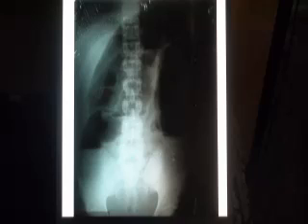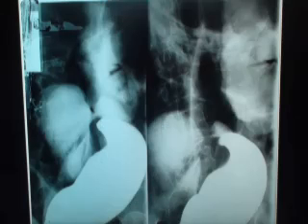You can see here volvulus of the colon, and it's hugely distended, dilated and full of air, and we can say it's omega shaped colon or three lines radiating to the pelvis. This is the same problem. We have here the hugely dilated colon, and this is a mesentery in between, but this is not a normal X-ray like the previous one.